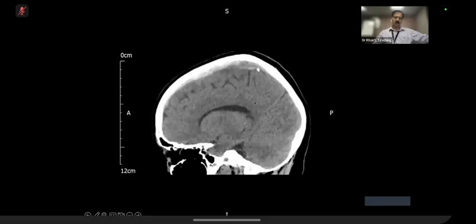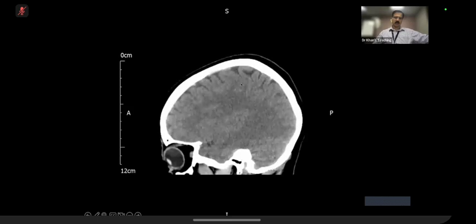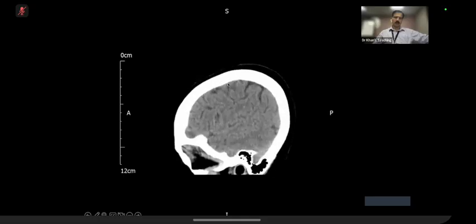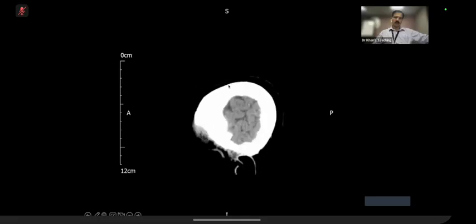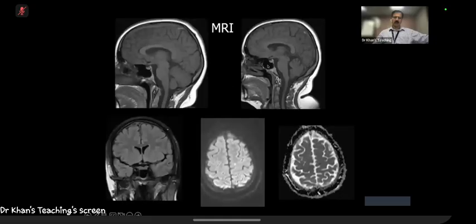And so this is the superior sagittal sinus. And some of these veins where I'm pointing out, these are thrombosed. So we did an MR, initially a CT venogram. On CT venogram, you can see this filling defect in the superior sagittal sinus. On MR, you can see some high signal where the sinus thrombosis is. You can see loss of signal void on this FLAIR.